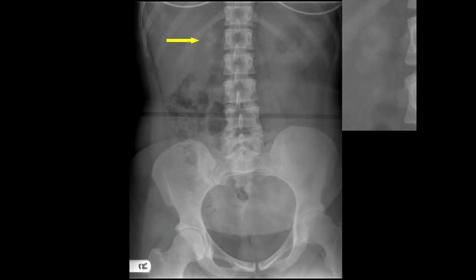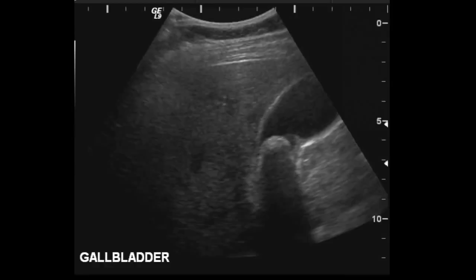Okay. So that's just the zoomed in view to show you the calcification here. And then this is just the soft tissue, looks normal. And this is additional opacity, as I say, artifact. So, and again, this patient, if he was symptomatic, will do ultrasound to take it further. Yeah. That's the ultrasound on that patient. Okay, the same patient? Exactly, same patient. So you can see nicely distended, thin-walled gallbladder here.